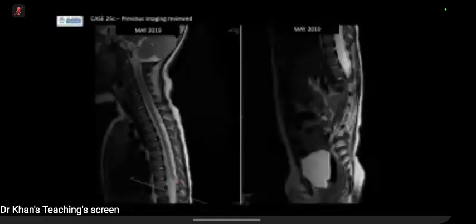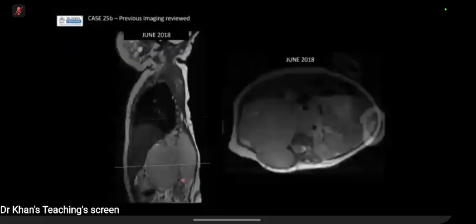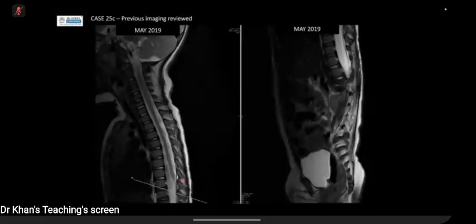You've got long-standing myelomalacic changes. So the patient's actually paraplegic because of the treatment. And subsequent to that, he's developed disuse osteopenia, and those are actually insufficiency rather than pathological fractures. But pathological fractures, given the history, would also be reasonable.